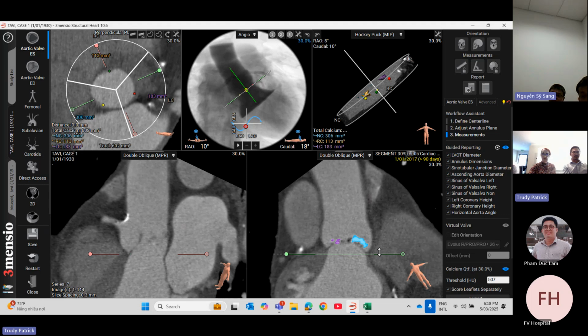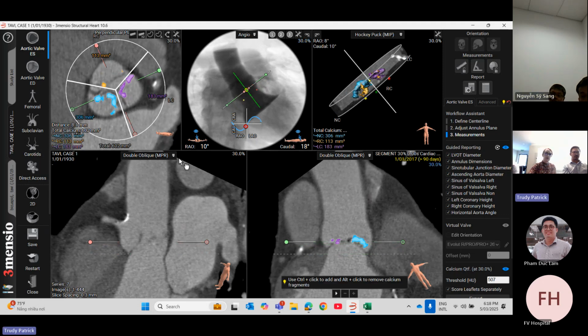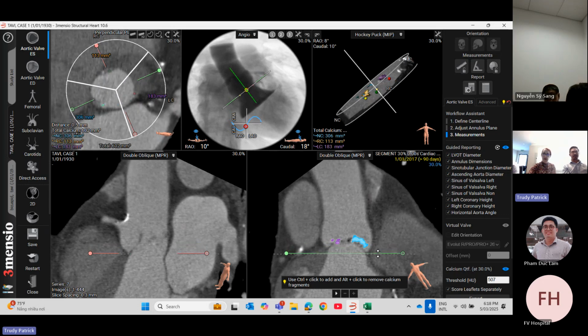See if we can see. Yeah, it's not going to work. I just thought we might be able to play with it on here, see if we could create it, but I don't think we can. We don't have a calcified one. Just got this bit here.